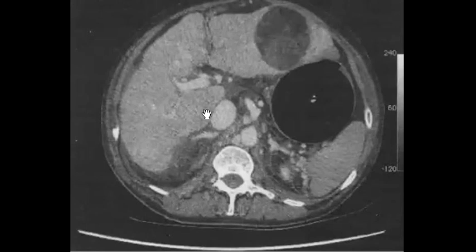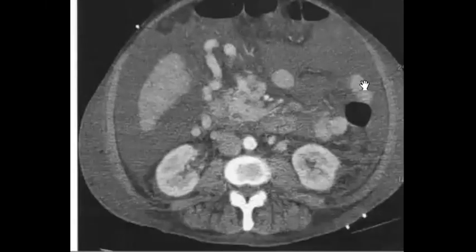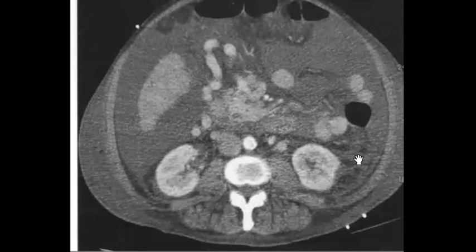It's important to comment about the portal vein, if there is any vascular invasion, and also about the hepatic artery. And if there is any change in the ascites, I see one of the good comments is about the density of ascites, because if this patient has HCC and it has ruptured, then the density of the ascites will be high.